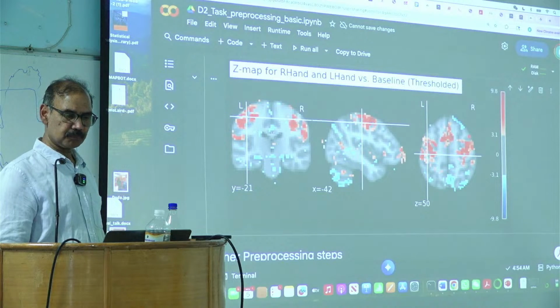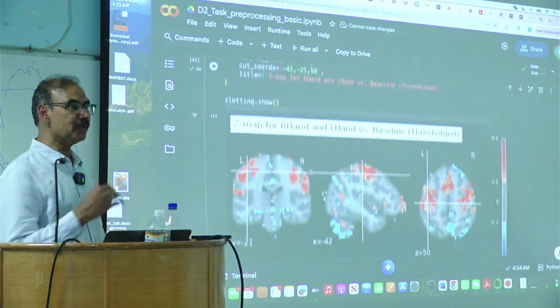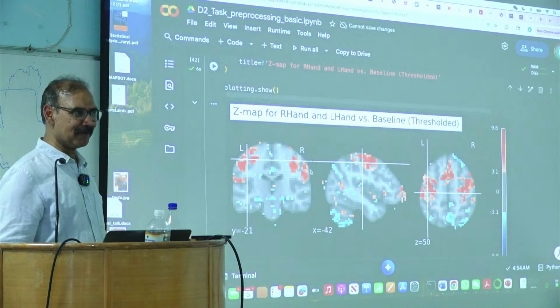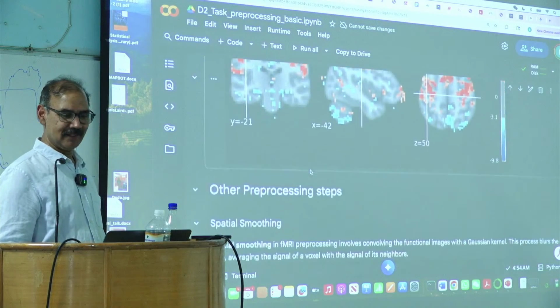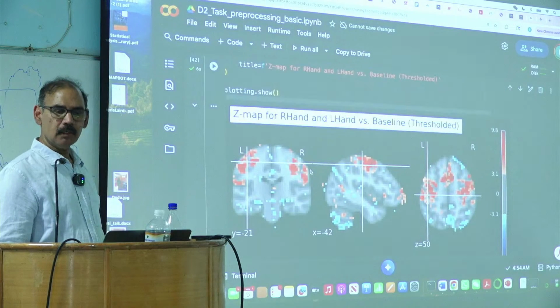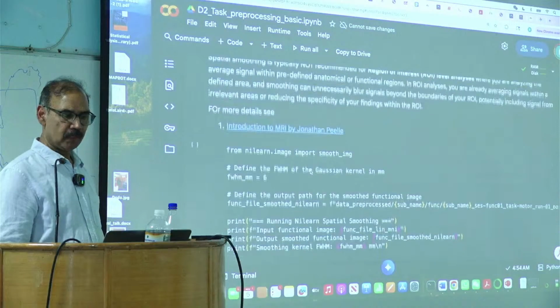Okay, all right. So this is with a threshold of 3. When you give your presentation, you have to tell me how you determined your threshold, right? Okay. So this is what we have so far.